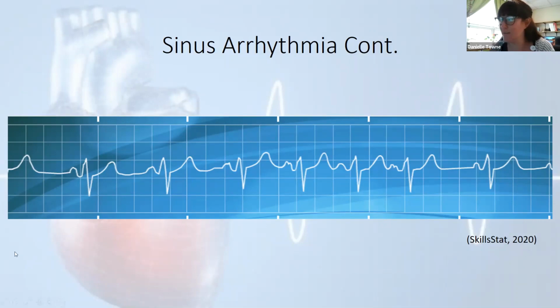So could they have a sinus bradyarrhythmia, where they have an arrhythmia like this, but it's too slow, or a sinus tachyarrhythmia, where they have an arrhythmia that's too fast. So there's probably something else that's going on, but just a standard sinus arrhythmia with a normal rate between 60 and 100, typically not going to see any symptoms, and there's not going to be any intervention.